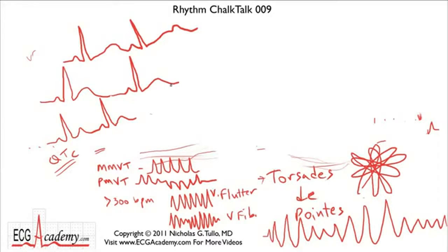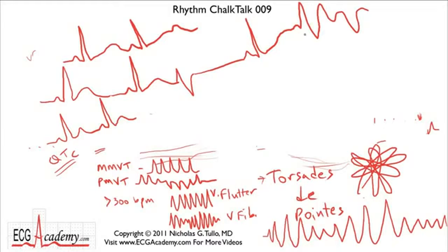But in Torsade, you'll see that the T wave becomes really bizarre after a pause. So let's say you have a PVC here, and then you have a compensatory pause. After that pause, the normal beat comes in, but if you look at that T wave, it's really big and long, with crazy U waves and so forth. And then what you usually see is the first beat of the tachycardia arises from the T wave, or from the TU complex.